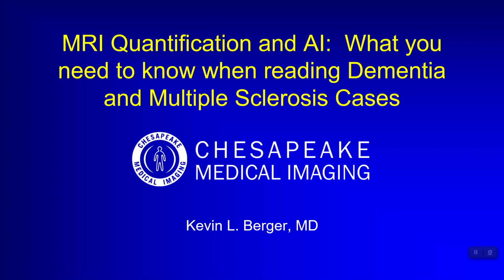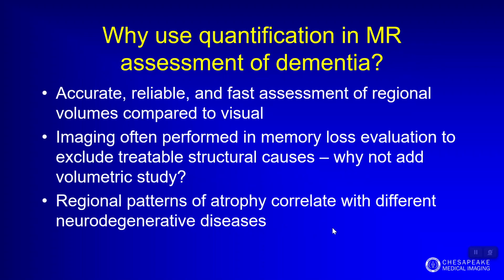MR Quantification and Artificial Intelligence. What you need to know when reading dementia and multiple sclerosis cases. Why use quantification in MR assessment of dementia?